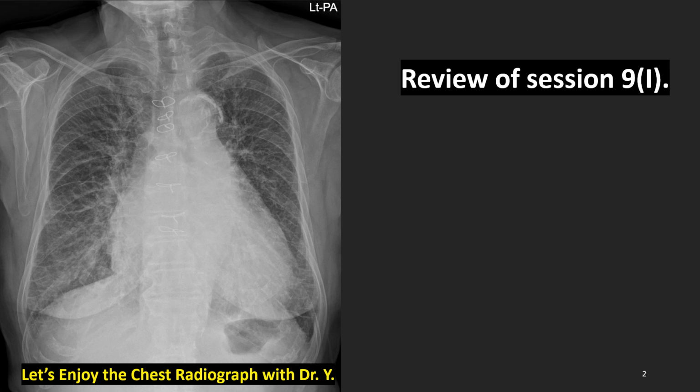We are familiar with this film, this imagery, these radiologic findings. Now I will say words and you point where it is. Okay? I think you will do it quite well. Yes, first, cardiomegaly. Yes. Blood diversion of upper part, in other words, cephalization.